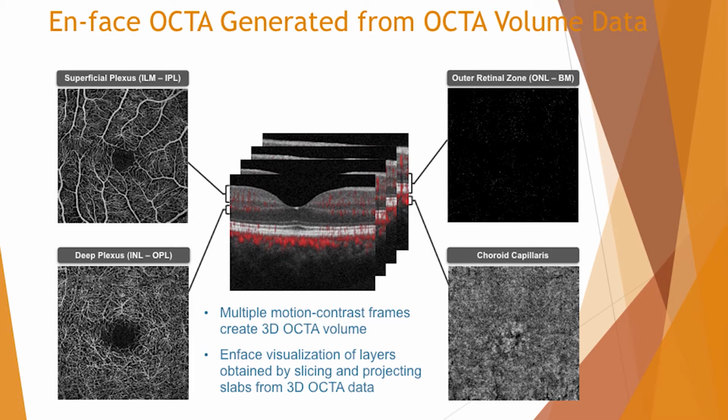So essentially, if you look at the retinal anatomy, that correlates with your B-scan, right? You have cuts that correlate with retinal anatomy. The OCTA is now going to give us the vascular pattern to each area of the retinal anatomy, okay? So you take your first cut, your first en face, through the superficial retina. The superficial retina is ILM to IPL. It's fed by the superficial capillary plexus, okay?